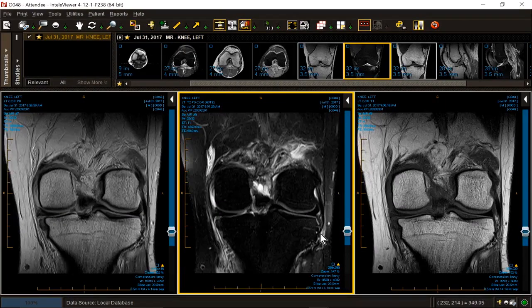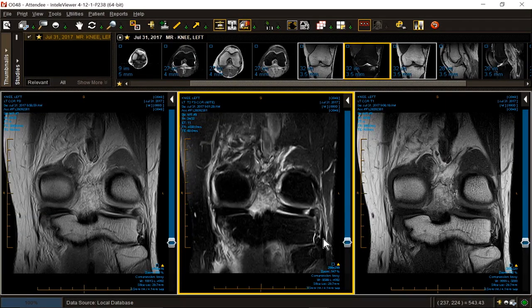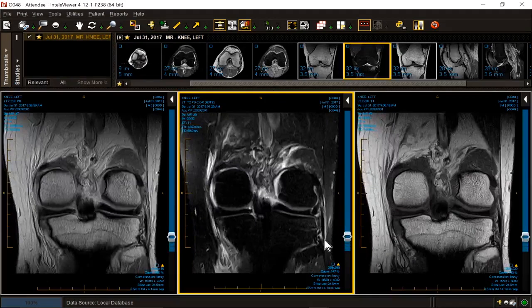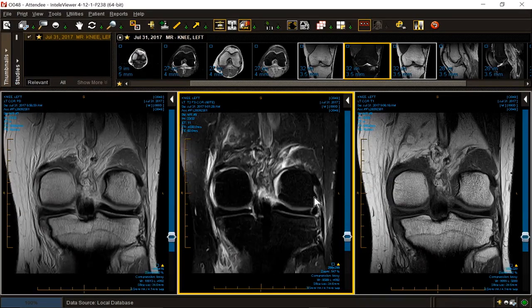It's fine. Segond fracture? No. Footprint of the FCL and biceps femoris intact? Yes. Popliteus tendon intact? Yes. We said, though, earlier in our axial assessment that the semimembranosus looks swollen. Better check it out. Time for some sagittals.